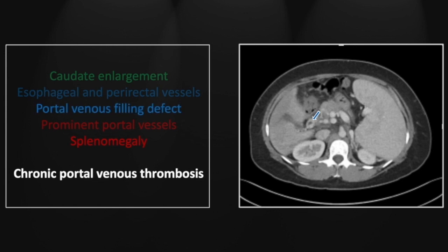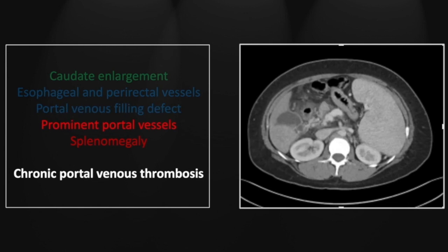Simply based on that, you might call this acute, although we will see on the movie this extends farther up into branches in the liver and could be appreciated on previous studies as well. So it is in fact known to be chronic. And again, the marked splenomegaly.